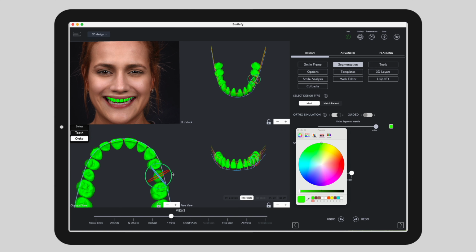Correct axial angulations. Once the teeth are positioned on the curve, adjust their axial inclinations. Correct mesiodistal angulation. Ensure the buccolingual axis is harmonious. Align long axes symmetrically relative to the facial midline. Proper axial angulation is critical for functional occlusion, natural aesthetics, and predictable veneer preparation.